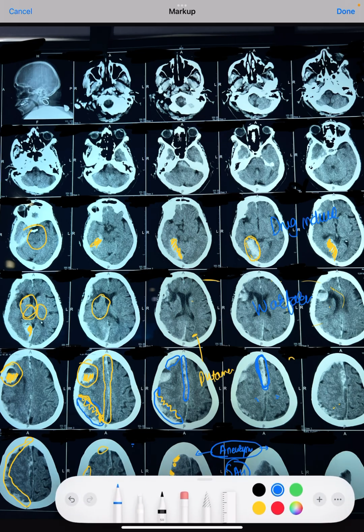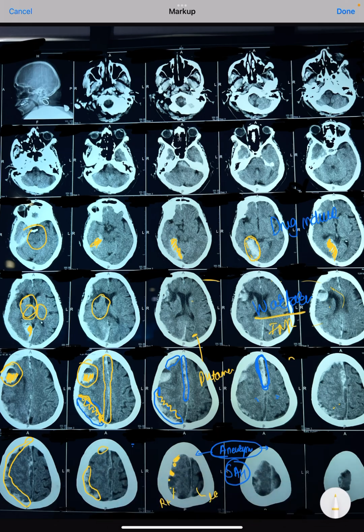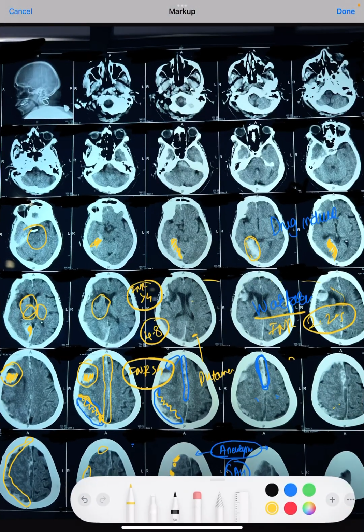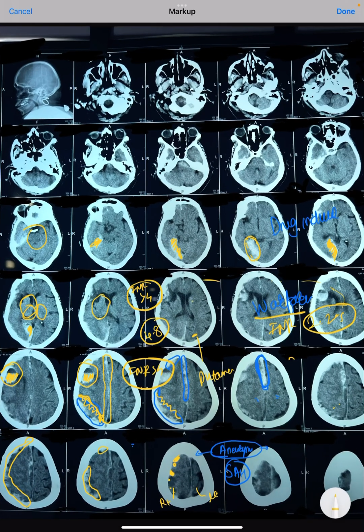We must know that the target INR for warfarin treatment is around 2 to 2.5 in most cases. Whenever the INR is more than 4, there is increased risk of bleeding, and they can bleed in the brain. In this particular patient, it was 4.8. So this is a typical case of warfarin-induced bleeding or drug-induced bleeding.